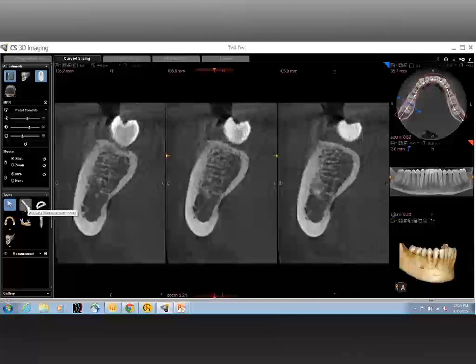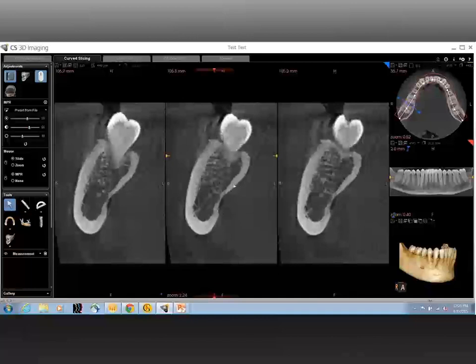Now, beyond that, you also have to look at the lingual undercut. Every human being, all of us, have some sort of lingual undercut to some degree. Is it a very critical finding? Probably not. But in terms of implants, it is important to note, as you notice, that there's a slight thinning of the cortical bone there.